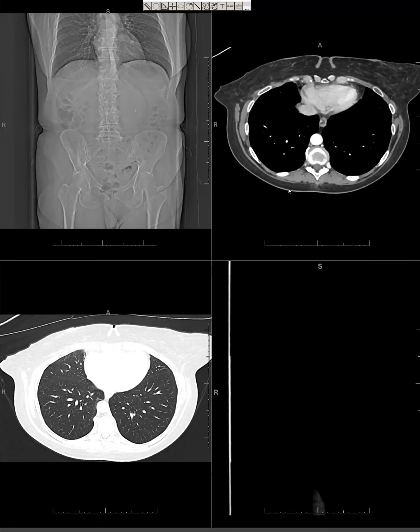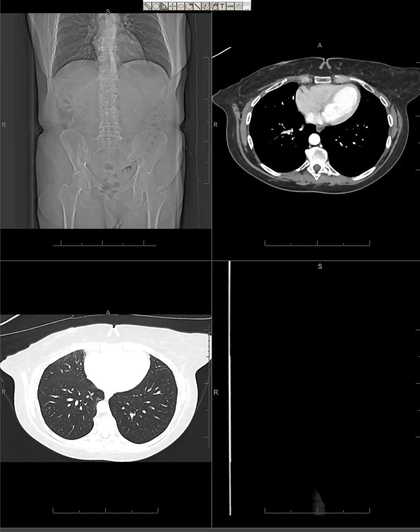This is a case that a colleague brought to me and said, there's something funny going on with this liver. And it wasn't done for the liver. Of course, I'm getting a call. Hang on, stop the recording. Okay, it's basically done as, believe it or not, a CT enterography.